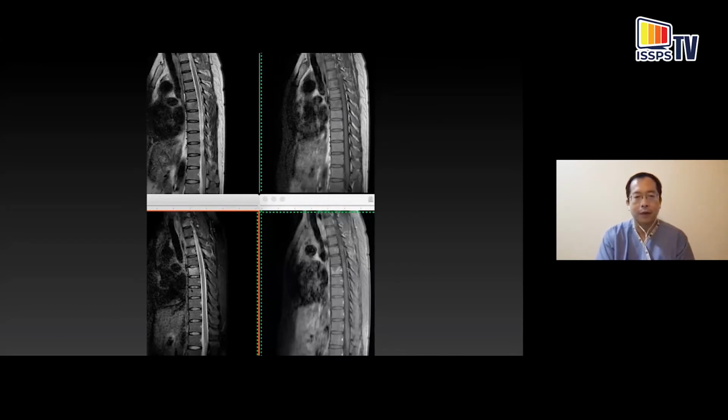It suppresses the fat signal and only leaves us with fluid signal around the spinal cord, the CSF around the spinal cord, within the intervertebral discs fluid, and also if there is pathology within the diseased vertebral bodies and the spinous process here. And this is an inversion recovery or a stir sequence.